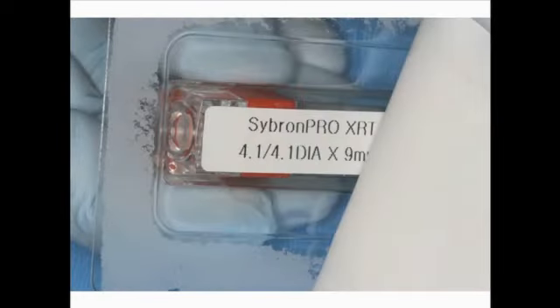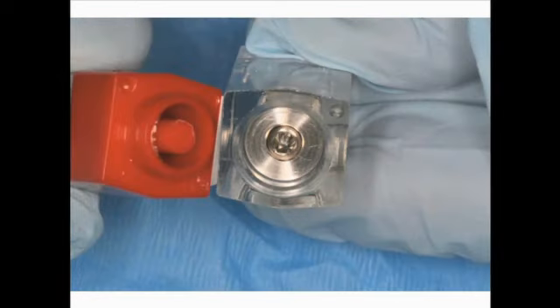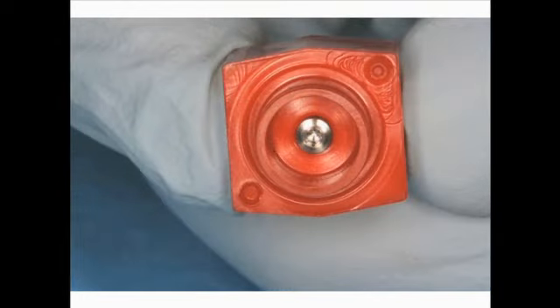We open that package and you can see how the implant is actually sterilized in position. Again, clearly delineating the size of the implant and the type of implant that we're using. When we break open the internal packaging of the implant, you can see the internal design of the implant itself on the right-hand side. Now, with this system, a cover screw is also included in the packaging, and it's in the other part of the package. So there's no added cost for a cover screw.